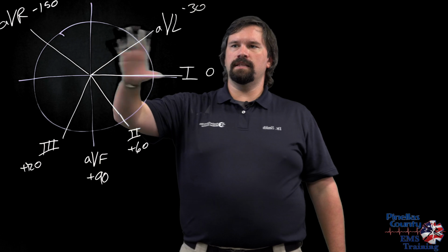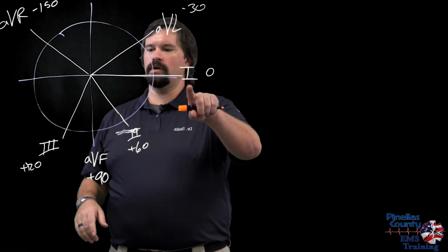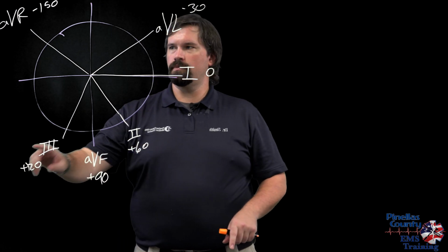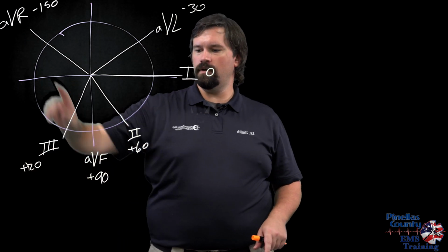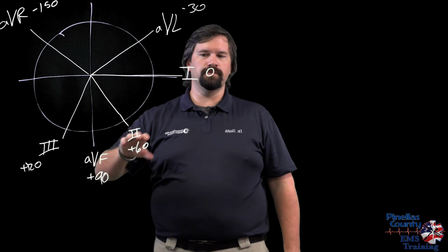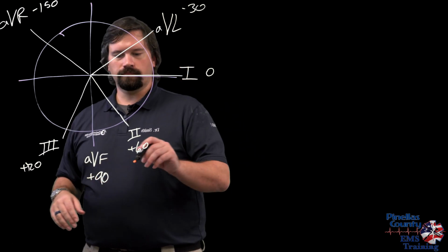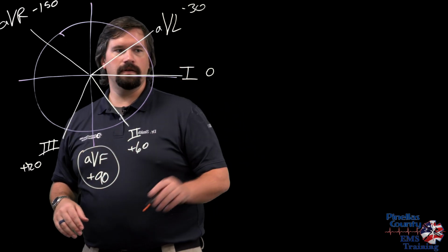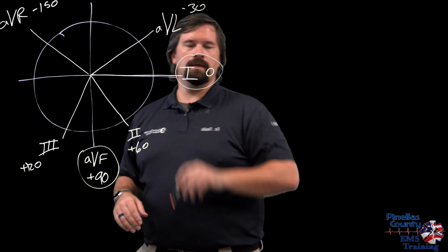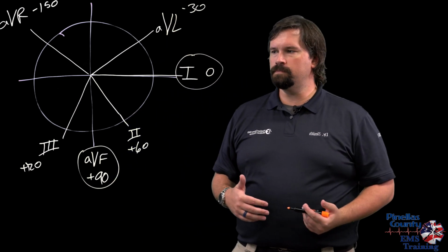So looking at the EKG, I went ahead and drew it out, but here's some of the EKG leads. So we have 1, 2, 3, AVL, AVR, and AVF. Now we don't need all these to look at the axis. Really, the ones you mainly need are AVF and 1. There's many methods to look at axis. I like the 2-quadrant method. It's a more simple one.